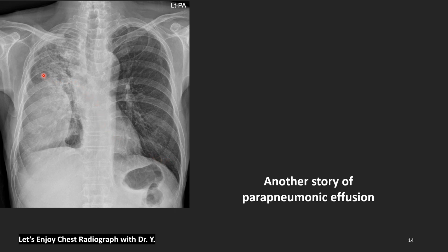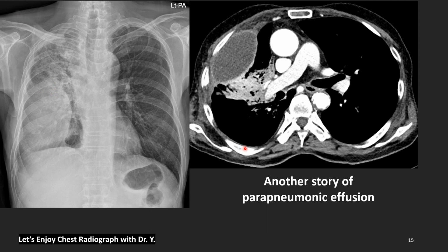This patient shows right upper lobe pneumonia, including middle lobe pneumonia, with homogeneous, round, well-defined border medially representing pleural lesion, not lung lesion, with homogeneity. So we can define as pneumonia with pneumonic effusion or empyema. This contrast-enhanced axial CT image shows the pneumonia and localized empyema here. So pneumonia with pneumonic effusion, and why this line is so clear, sharp, because this one is not from lung, but from outside of lung, pleural or extrapleural lesion.